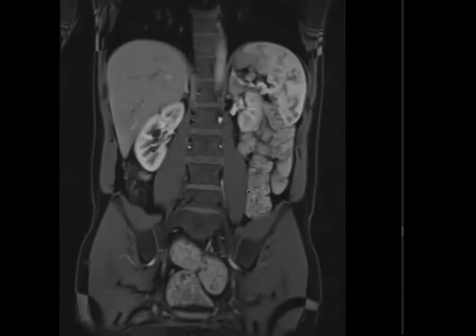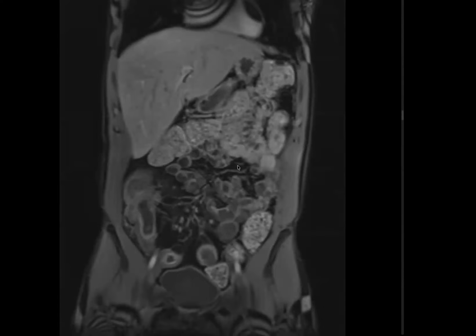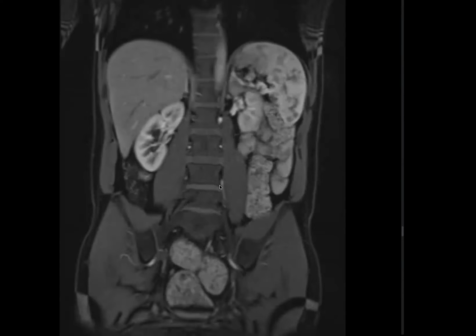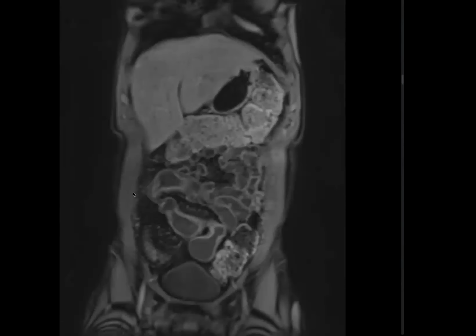Yes, sir. You got the diagnosis right, but you missed an important factor, which is complications. So Crohn's, you described, don't bother with normal and expected descriptions. So fecal loading, liver, kidneys. If you know they're normal, just say rest of the solid organs appear normal. If you're confident, say it. You don't need to describe it, because you immediately noticed that the pathology was in the bowel. So spend your time saying what you want to say about the bowel.